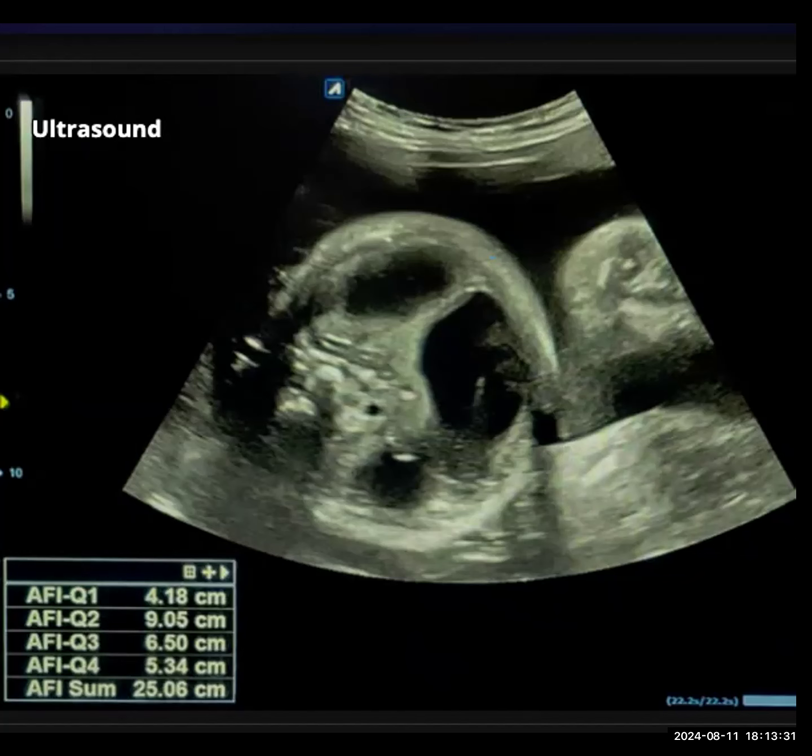I'm not able to make out which part of the body it is. I think this is the abdomen. So what do you think this structure is? These are calcifications which are giving a lot of posterior acoustic shadowing in the posterior part of the abdomen, with likely bowel loops anterior to it.